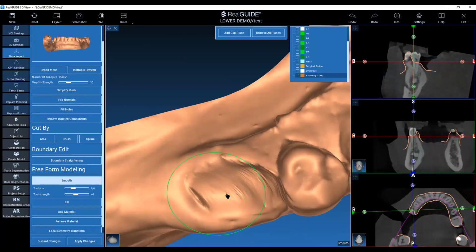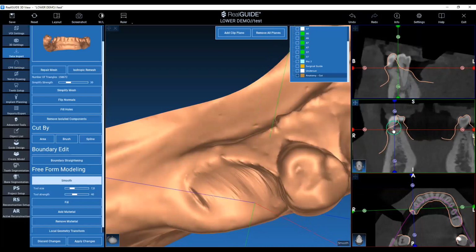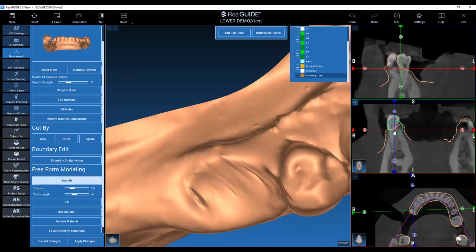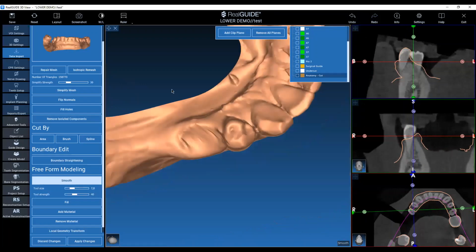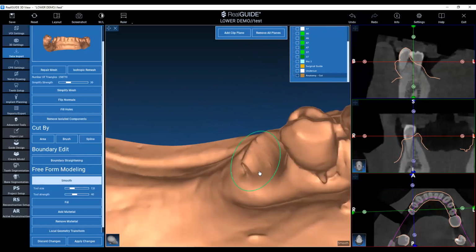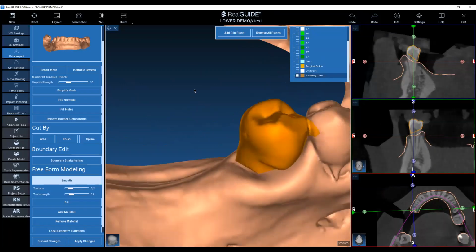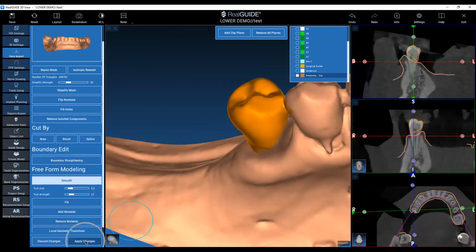And you can do this also on 2D views. You can also work in this view. So both ways are possible. You can work the same in the different views, and all the modifications are real time. So if you do something here, also these images will be updated, and the other way around. So that's the first thing. The object is here, so you can always make it appear from this section. If you want to apply this modification, you just need to click on Apply Changes.